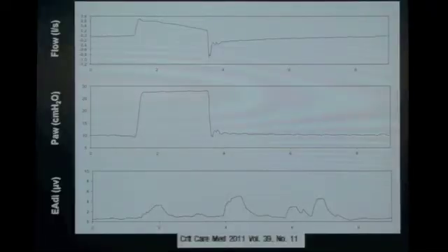And so, be honest, no one would ever imagine this type of asynchrony without measuring the EMG of the diaphragm. And you know, this kind of tracing is not an everyday finding, but it is more common than expected. And you know what?